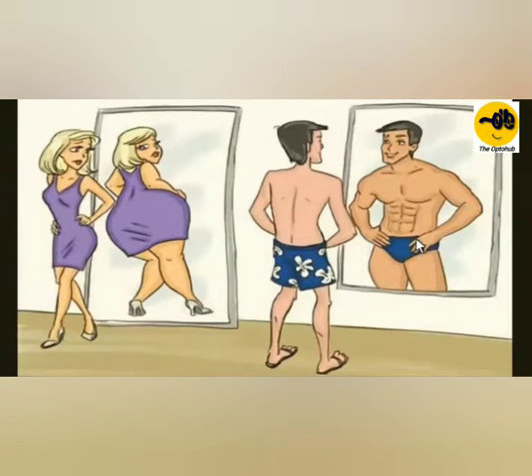Okay, so as I told you, it is reflection based. In this photograph, you can see a woman and a man standing in front of mirrors. Now let's assume that these mirrors are corneas. This is a cornea, this is a cornea, and the woman and the man, both of them are placido discs. Let's assume that. So when the placido disc is shown, the cornea will act as a mirror and send some light back.